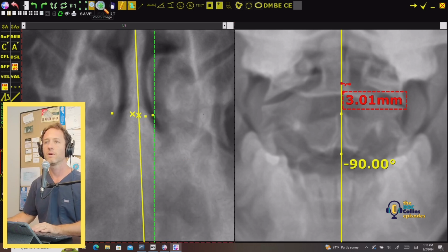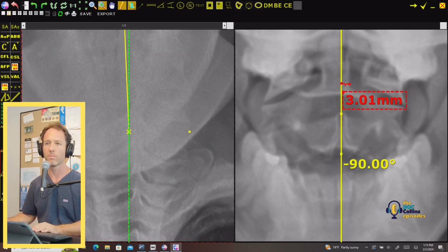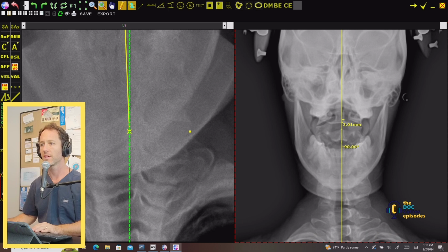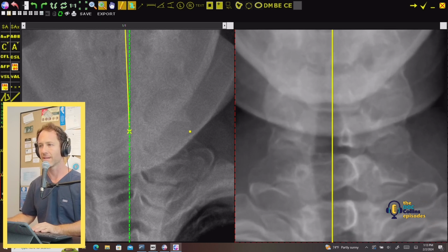And now we're going to move on down to the lateral margins, the lateral borders of C7. Which if you've got a pretty high S line, you know, you start getting above 15, it can be pretty blown out. So again, it's nice to have that axial view that's taken at a lower S line, typically, you know, 0, maybe around 10. Sometimes it's even negative. That'll give you much cleaner bodies.